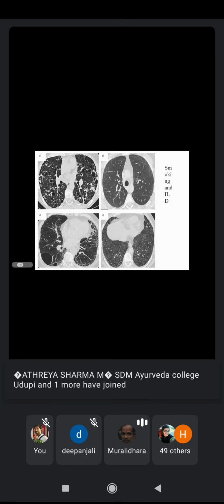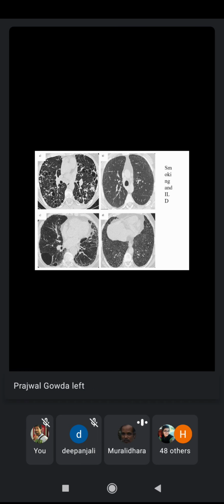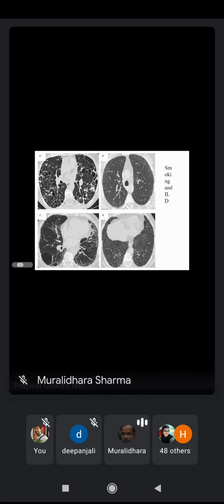In the second, lower image, you can see many big vacuole-like structures. Some of these alveoli are fully dilated and quite big, as a bubble of air is formed, and there could be an increased density of the fibrous tissue, which is like a uniform distribution.